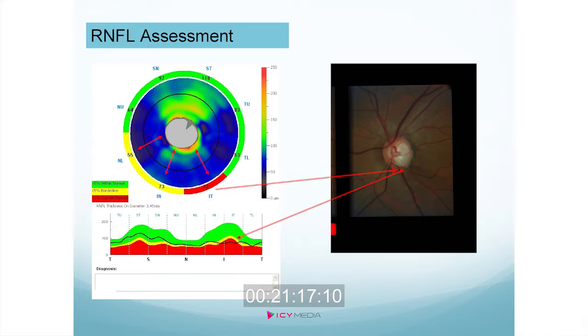The ring around the outside shows how statistically significant each area is on the rim tissue. And this is showing us that in the superior quadrant, superior temporal, it's normal. What happens inferior and inferior nasal, at least on this printout, it begins to veer outside of the norms. You can see the coloration, the yellow and the red, is showing us that on a statistical significance scale, it's outside norms. The tissue on the inside, around the cup and disc, is that thickness on a micron scale.